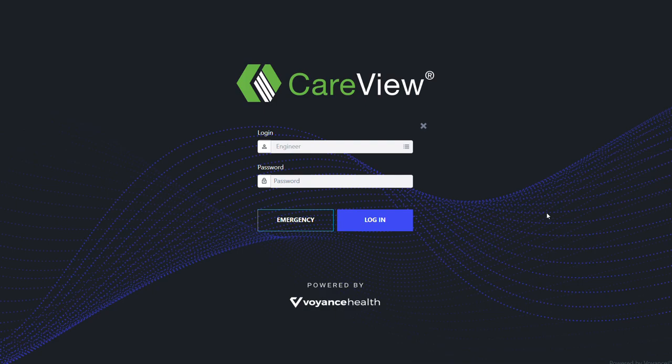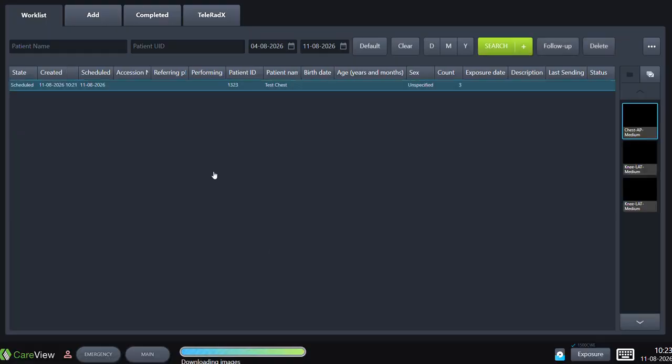This is a video demo for our new Careview software to be used with Careray X-ray detectors. This is the login screen which you get after you open the software. To log in, click on login, and this is the work list.